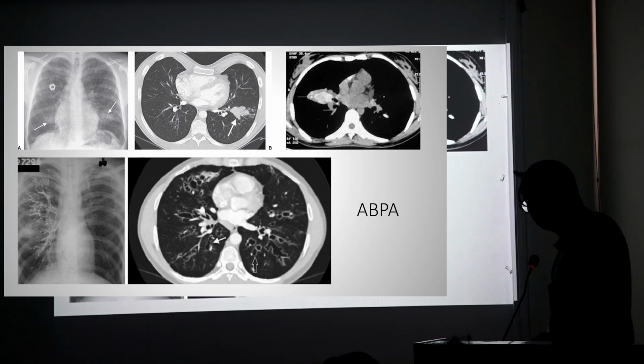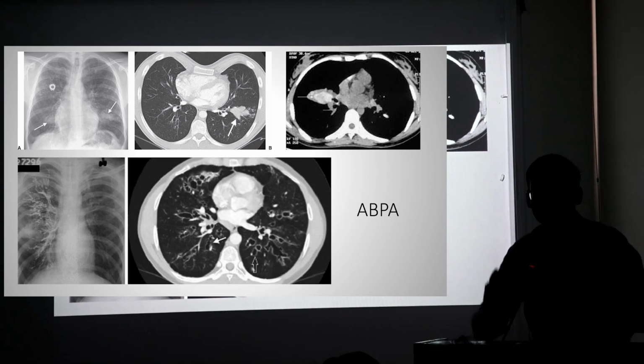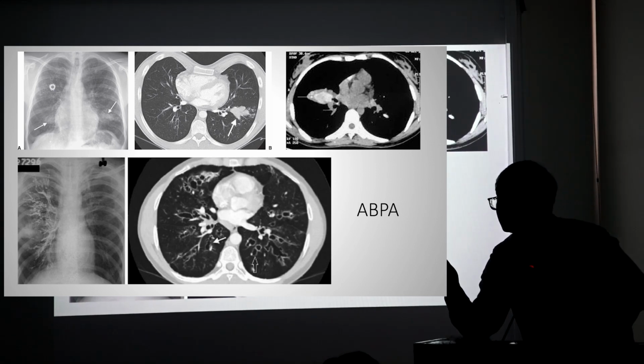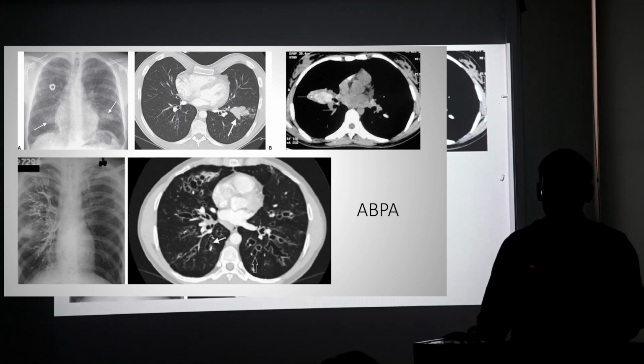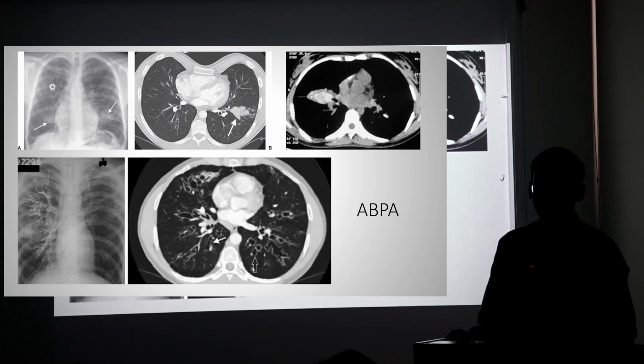Can we see in the right uppermost corner that there is a lesion? In the central portion of the lesion, it is whitish in color. So it is high attenuation mucus. So these all, if the patient does, pardon? No. This is a case of allergic bronchopulmonary aspergillosis.